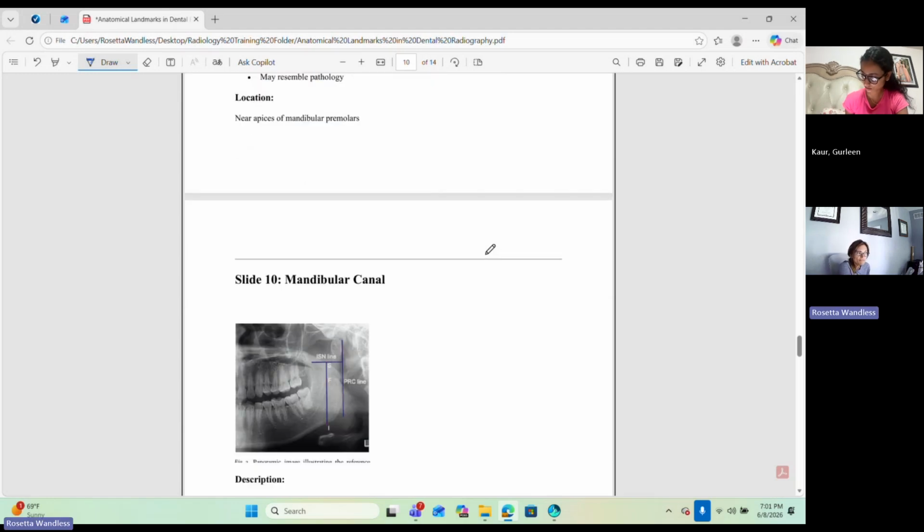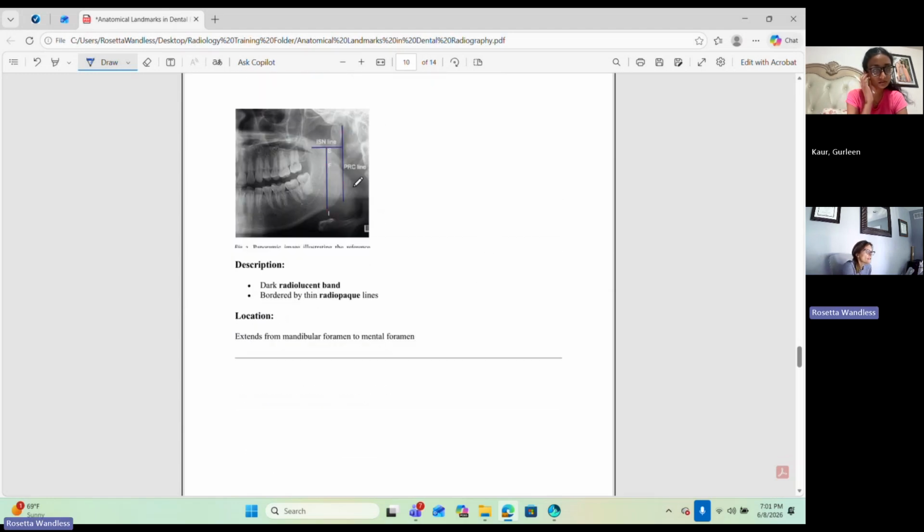Now we just kind of reviewed the mandibular canal, but here it is. So the mandibular canal, it's actually that area right here. Do you see that empty space? You see this white plate? Hard to see a little bit, but it's marked by that radiopaque area, and then the inside's the cavity. So it's almost like a mandibular jaw, like I'm going to use the word sinus, because the floor of the bone is a little bit thicker on both sides to house it, so it protects the nerves and the blood supply. Think of it that way.